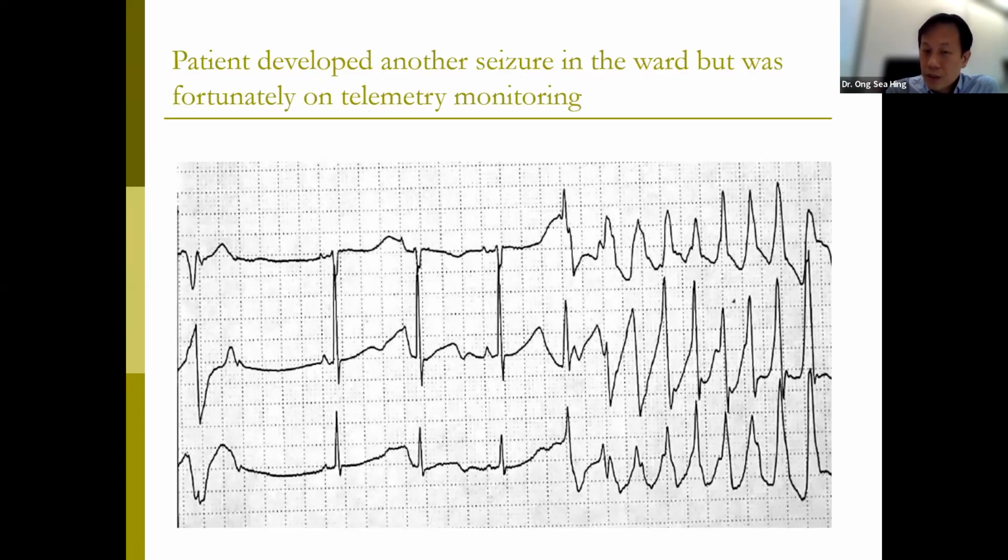In ICU, the medical officer on call was sitting chatting with the nurse in front of the telemetry station, and he saw this rhythm. So the patient actually went into Torsade, okay, and they quickly contacted the ward and they shocked this boy out of the polymorphic VT, and he survived. He was only a 20-year-old boy. If he was not on telemetry and if nobody saw this, he probably would have died that night.